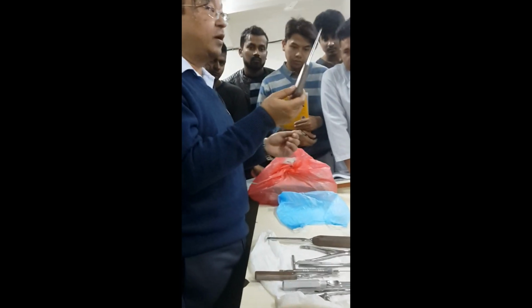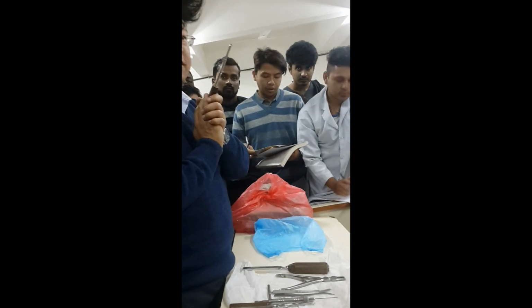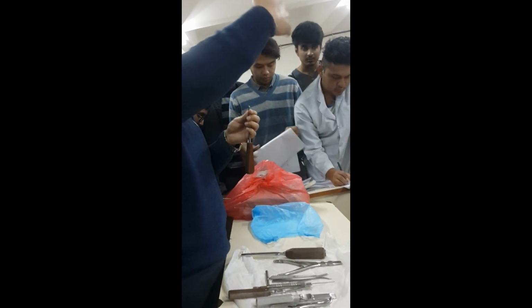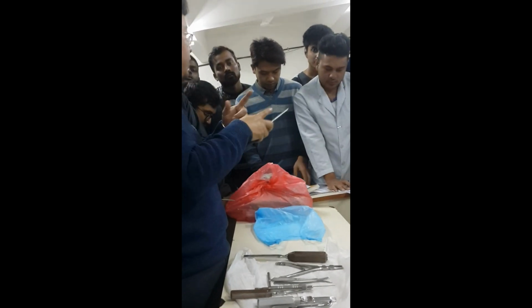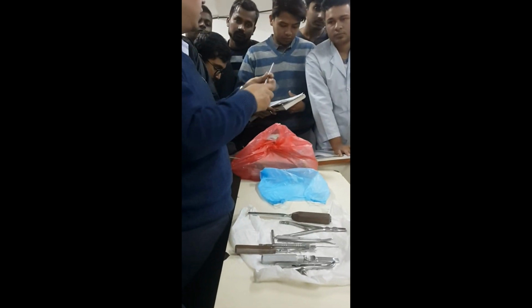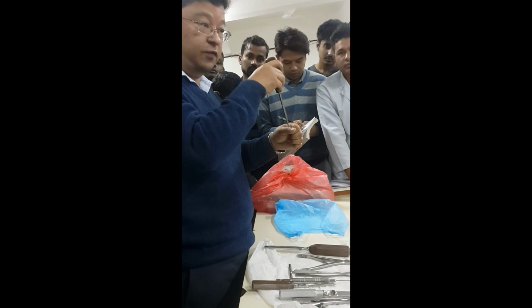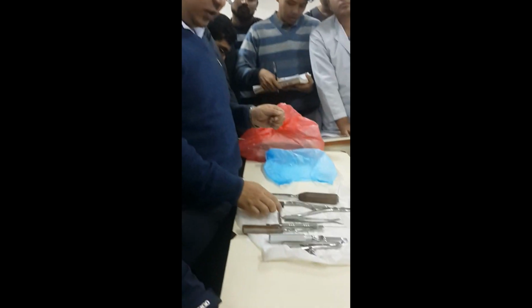So this is a screwdriver. When you say it, you have to say hexagonal screwdriver. If you look at the tip, it is hexagonal. It's not like the normal screwdriver that you use in carpentry, with one simple line or a cross. This is hexagonal. Why is it like this? Because the screw head is like that. You have to fit snugly, then screw in the screw. So these are the instruments.